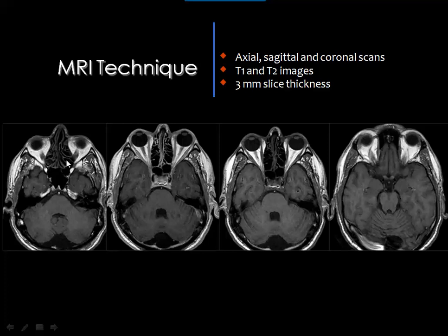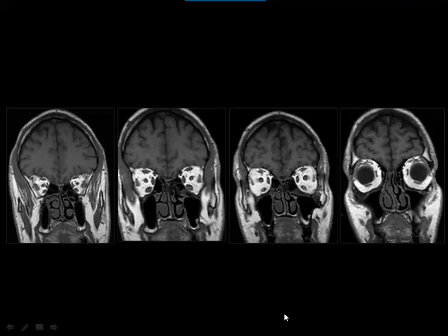This is the inferior section. You can see the inferior rectus muscle, and here is the optic nerve, lateral rectus, medial rectus, and this is the globe. And you proceed upward until you meet the superior rectus levator complex, and this is one of the important veins in the orbit, which is the superior ophthalmic vein.